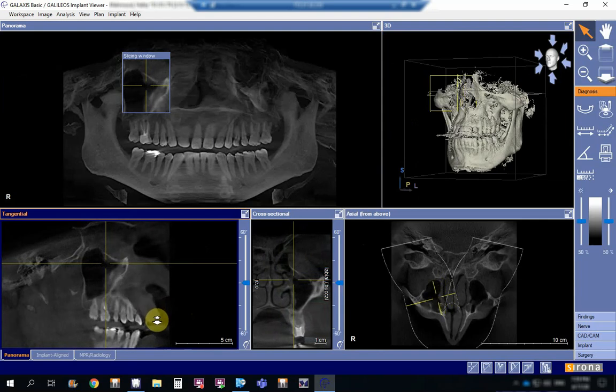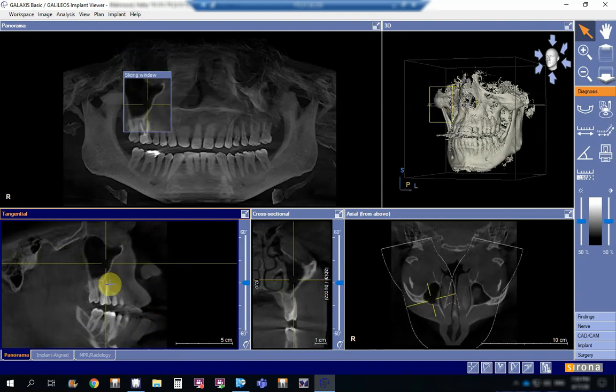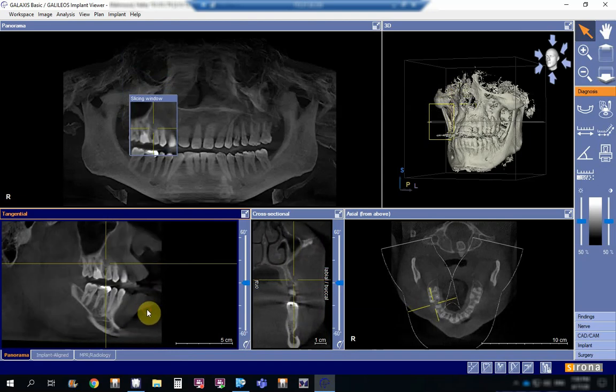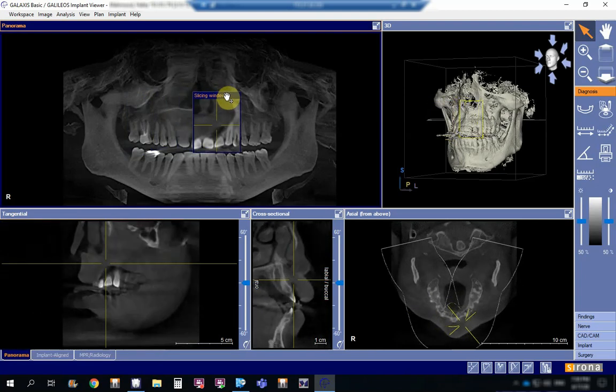Now we start in the teeth, and then we will go to the level of the maxillary sinus. Let me take you down to the level of the teeth. At the level of teeth, you can see it as if you're seeing it like an OPG. However, the difference is, as we said, in the OPG you don't have the ability to navigate through the different thicknesses of the tissues.